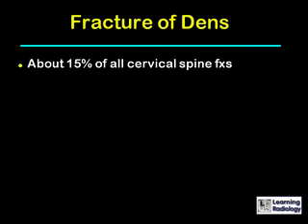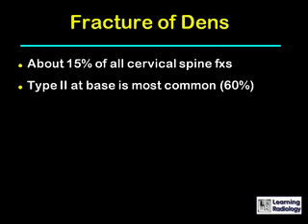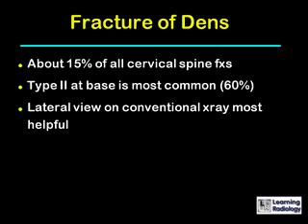About 15% of all cervical spine fractures are dens fractures. The type 2 fractures, which occur at the base of the dens, are the most common, 60%. A lateral view on a conventional radiograph is usually diagnostic, although CT may be necessary.